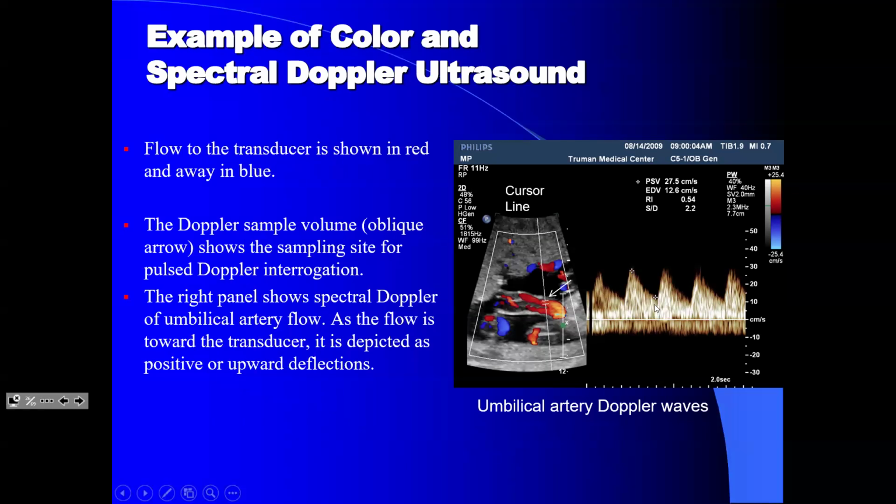As the resistance of blood inside the umbilical vessels increases, you start losing this diastolic component. So the waveform becomes spiky. Okay, this is important. So the blood supply can be studied; this abnormal waveform or high resistance flow inside the umbilical vessels tells you that the fetus is not getting adequate oxygenated blood, and the fetus is going into distress. And obviously, when the fetus doesn't get oxygen or nutrients, it will start developing IUGR.